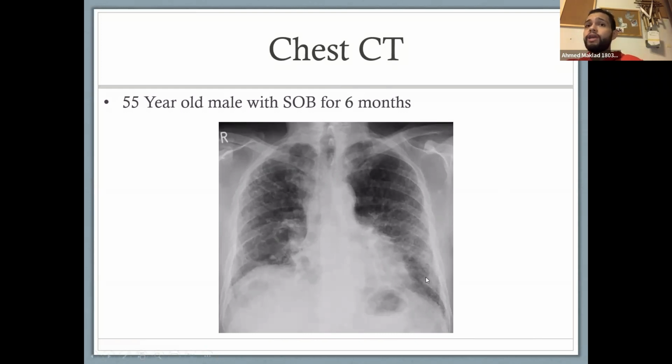So this patient probably has pulmonary fibrosis, and you can look throughout the lung field. You can see that both lungs, the whole lung is affected. You can see that there's distortion of the lung parenchyma in all the lungs, on both sides. Right. Usually, if the patient has pneumonia, it's probably going to be on one side. It's going to be localized to one part of the lung, and so on. All right. But this is a diffuse condition. It's a diffuse pathology, and it's taking way too long for it to be anything but fibrosis.